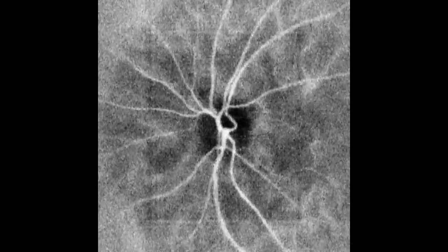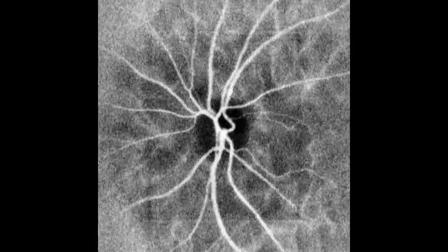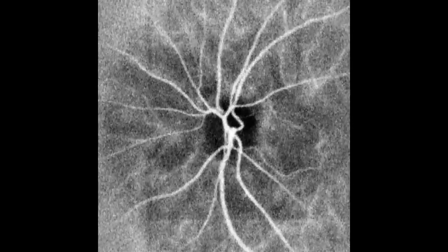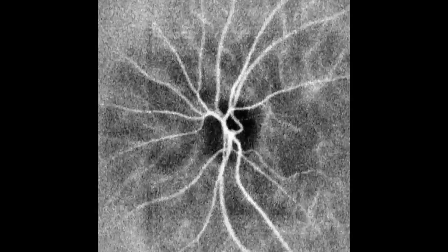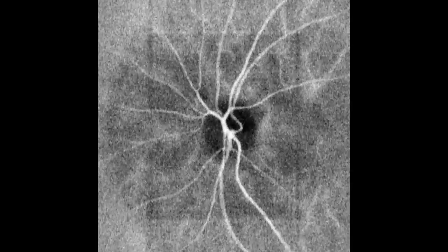Real-time Doppler holography with streaming cameras will predictably be enhanced in the near future according to Moore's law, because data throughput and computational power are the only requirements to enable non-invasive angiography with this approach.